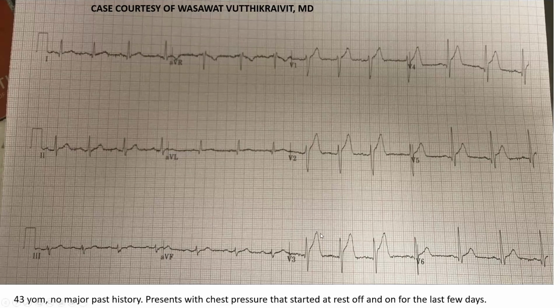One hint is whenever you see that ST-T complex equal or bigger than the whole QRS, that's always very concerning to me. Okay, that's an early sign of a STEMI.